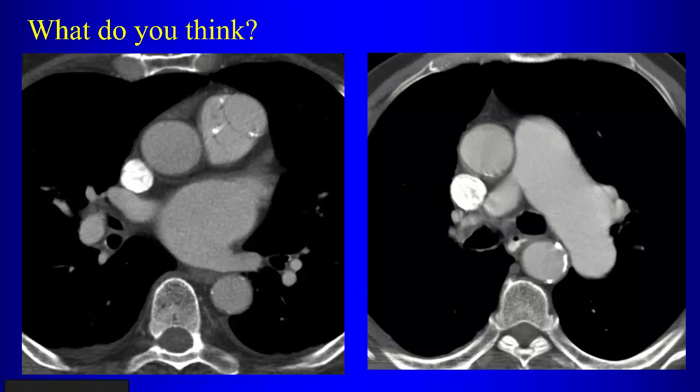Was there another finding that goes with pulmonic valvular stenosis here? It's quite an unusual finding, actually. Calcification of what? This is the pulmonic valve here. There's calcification of the pulmonic valve. You almost never see that, right? We commonly see calcification of the aortic valve, but calcification of the pulmonic valve is extremely rare. But calcification of a valve is an indication that my patient might have stenosis. So this is someone with pulmonary valvular stenosis. It's unusual to actually see calcification within the pulmonic valve, even in patients with pulmonary valvular stenosis.